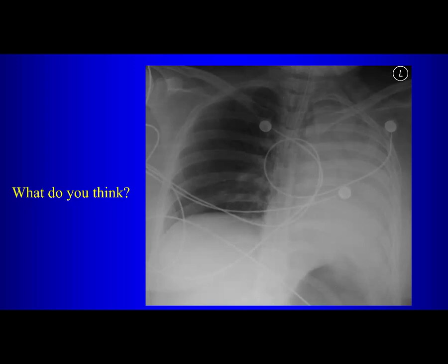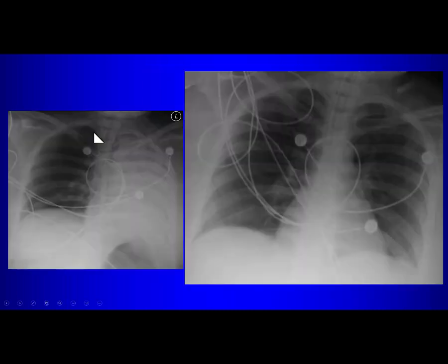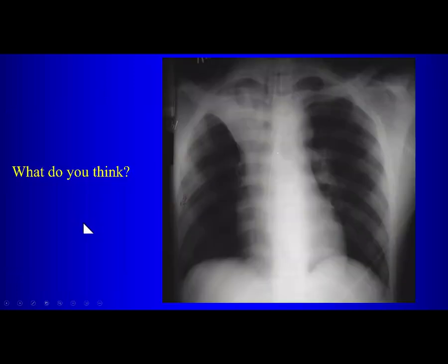Okay, so in this case, what do we have? All right, so here you would suspect what then? Mucus plugging of the left main bronchus resulting in complete left lung collapse, and the mediastinum is shifted to that side. The heart's also shifted to that side, that's why you don't see the right heart border, okay? So this is after sucking out the mucus plug, the lung expands pretty quickly. So that's a case of whiteout from mucus plugging.